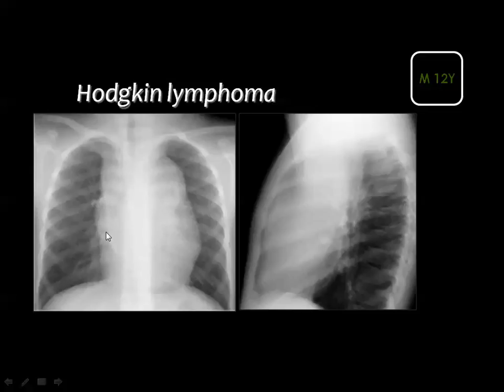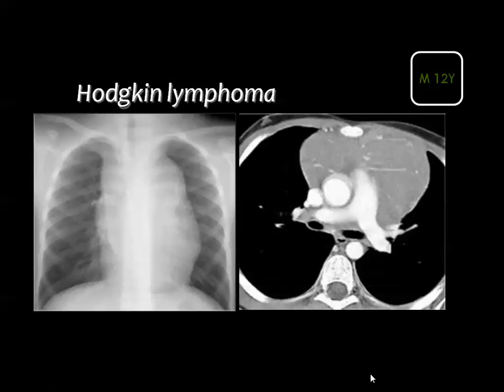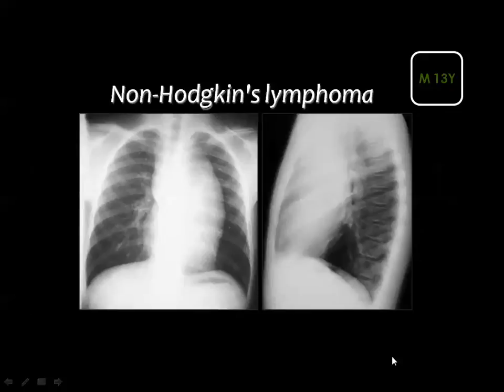And in the plain film, you see broadening of the mediastinal borders, and you see lobulation of the mediastinal margin. And in the lateral view, you can see that big, relatively ill-defined soft tissue mass obliterating or occupying the retrosternal area. And by CT, you are able to see the mass which is present in the retrosternal area, compressing the pulmonary artery and the aorta, as you can see here.